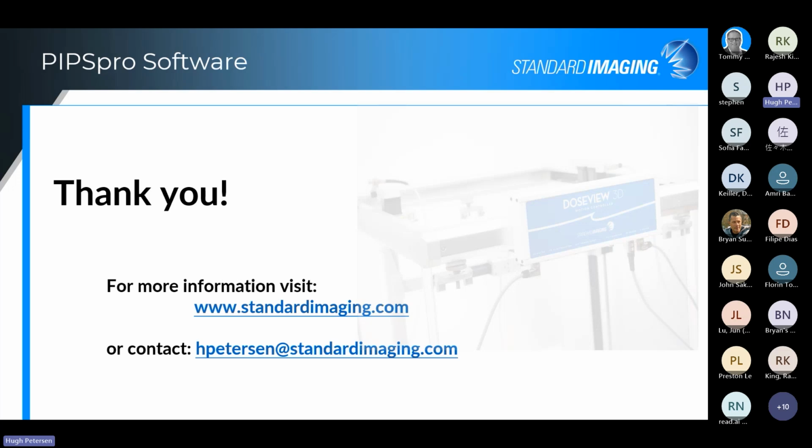Another question: what is the pitch value you recommend for the CT sim check process, utilizing the CT sim check Phantom? Basically, we say nothing different than using what your standard CT sim scan protocols are, acquiring a full CT image set of the Phantom. So going from covering the full Phantom, and then for consistency, you want to use that same protocol on a daily basis, not only for consistency of the imaging, for uniformity and all the tests, but also especially for those Hounsfield unit analyses, because you want to be able to compare your densities from day to day.